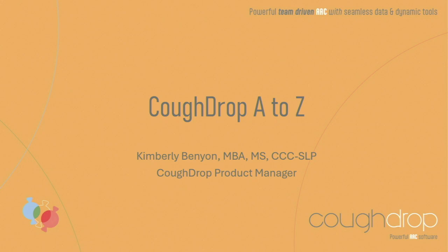But I'm going to try to get through the entire alphabet and all the things within CoughDrop within the 20 minutes and save a little bit of time for you guys to ask any questions.